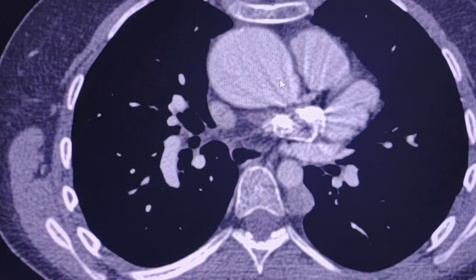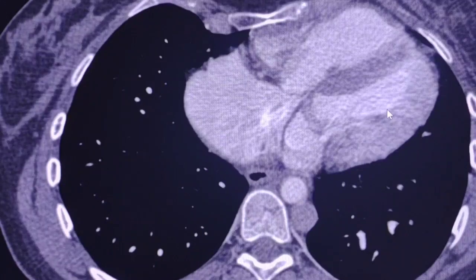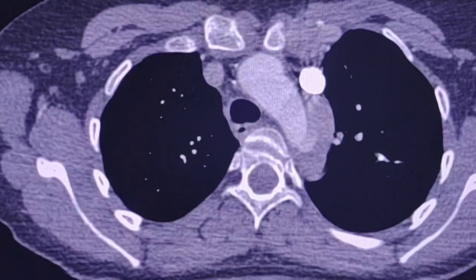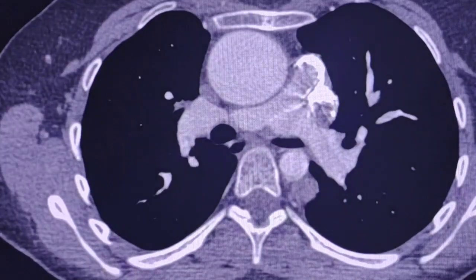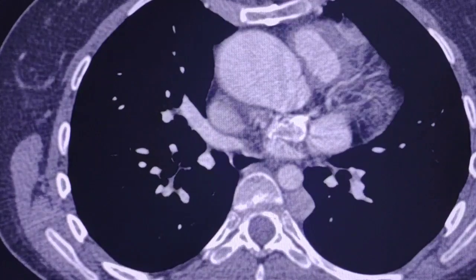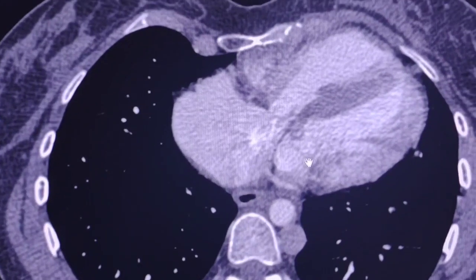Now we can see again the aneurysm in the ascending aorta, and the overriding position, which goes here, which is the left ventricle. Once more, I will scroll the images slowly from up downwards to have a general look again. So you will better be familiarized with this congenital condition, congenital anomaly.